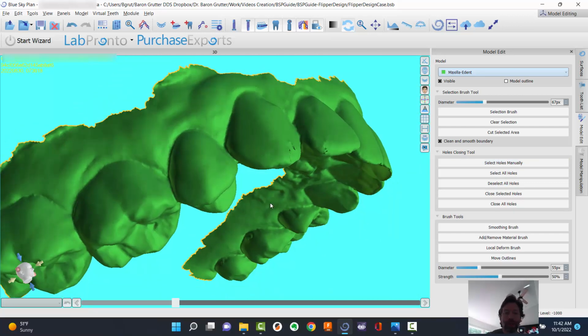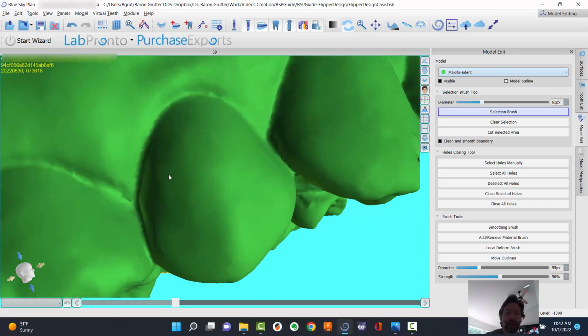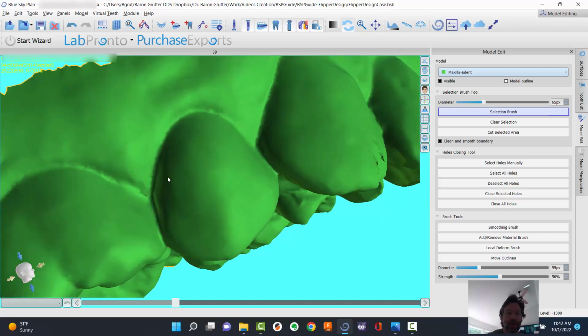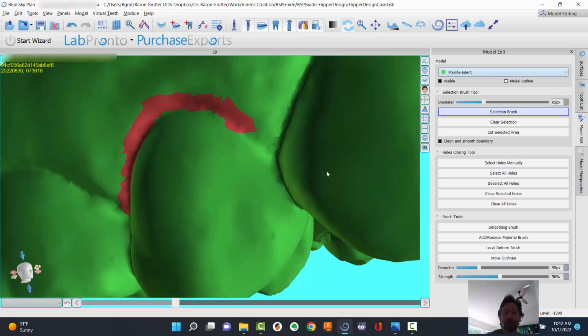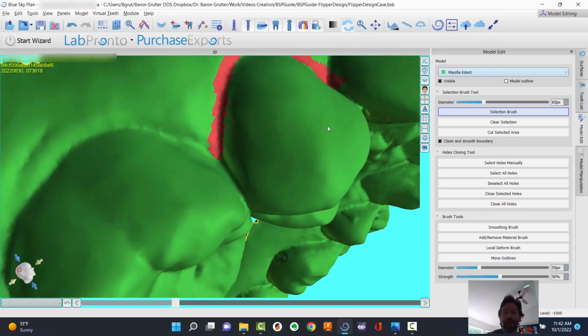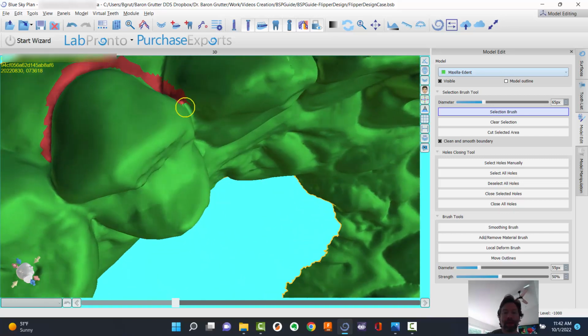What we now need to do is get ready to edentulate this tooth and remove it. Once again, we're going to use the selection brush, and I don't want this very big. You can zoom in or adjust the size with your wheel. So I'm going to zoom in, and then I'm going to highlight. I'm going to try to stay more on the tissue and the neighboring teeth than on the actual tooth. Not completely, I really want to get both, but more than anything, especially interproximally, we want to hit the neighboring tooth.